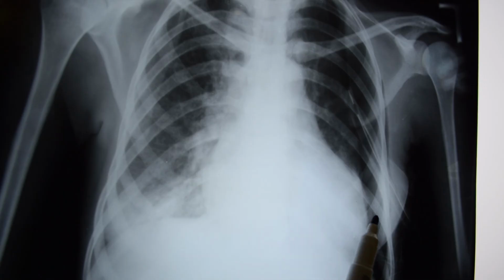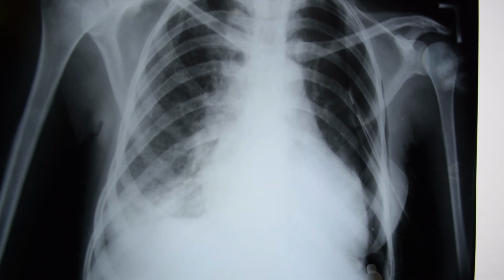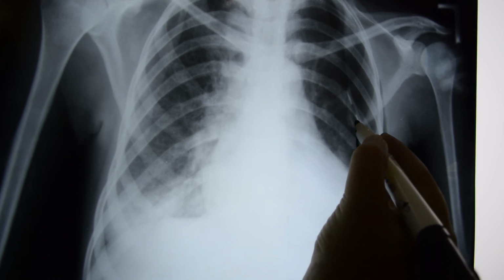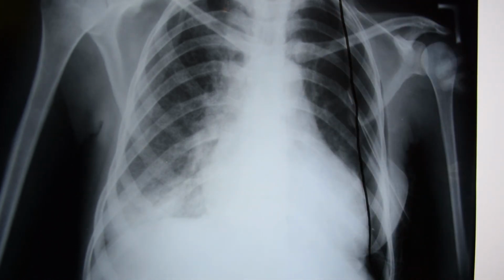This is the same patient, and this is the chest tube which is inserted in the pleural cavity, and here is a thin margin. And it is going like this. So the lung is expanded a bit and the patient's symptoms were relieved. So this is a post-op X-ray of pneumothorax in a case of CKD, and the lung is expanding, air leak was positive. This was the chest tube.